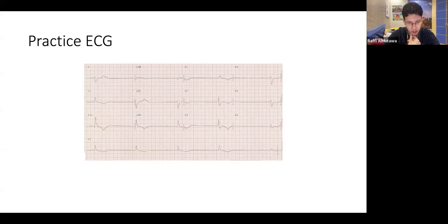All right. So this is in fact a weird one, if I'm being honest. No P wave, inverted T wave. Okay. No, I'm not going to throw you guys off and put MI questions here. It does look like an NSTEMI, but it's not. Something else.